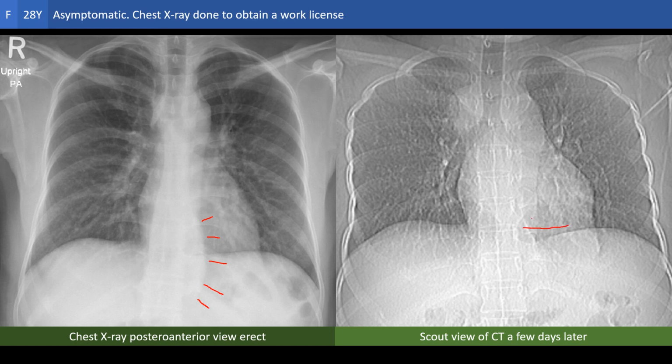First, the paravertebral abnormality is less obviously seen or nearly non-existent on this scout view of the thorax for CT. Second, you see here a new abnormality, which was not there before, at the right paratracheal region. So brainstorm the possible causes of these abnormalities until we meet the next time.